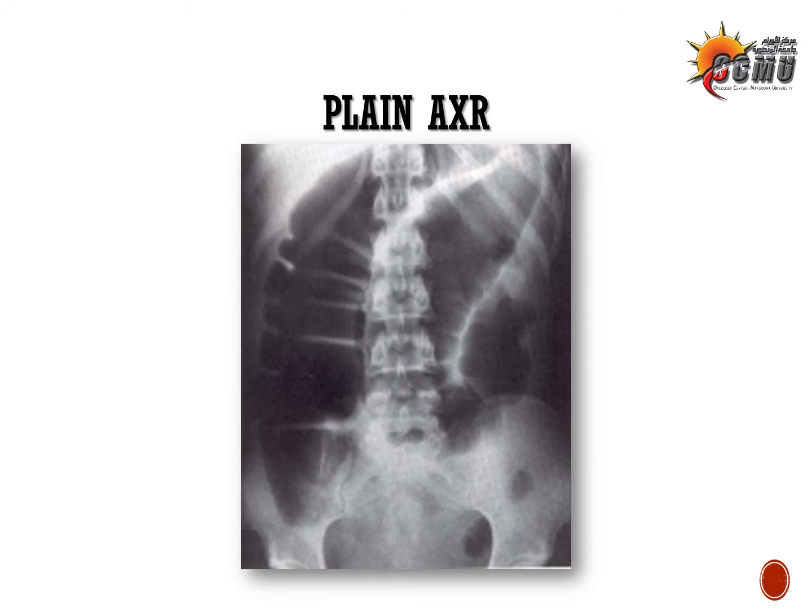Inside the lumen, there are the plicae, which are widely spaced. This is definitely not small intestinal lumen. This is large intestinal lumen. That's because of this one point. And another point is that the haustrations are incomplete. They do not cross from one side to another.